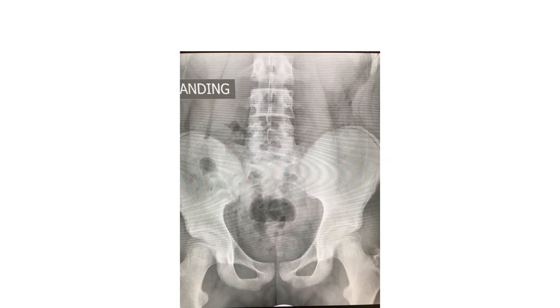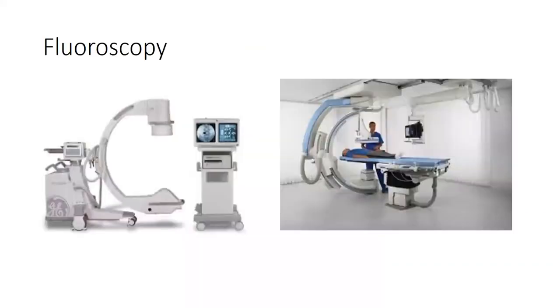Now, I wanted to show you some more tools. This is what we mentioned earlier. This is fluoroscopy, okay? Fluoroscopy is basically an X-ray, but it is an X-ray that has a lower dose of radiation. And you can see the setup on your left there. It looks like the giant letter C. So we call it C-arm. That's its nickname. Okay. The special drape we use to protect from getting contaminated is called C-armor, and so on and so forth. But it basically connects to this device.